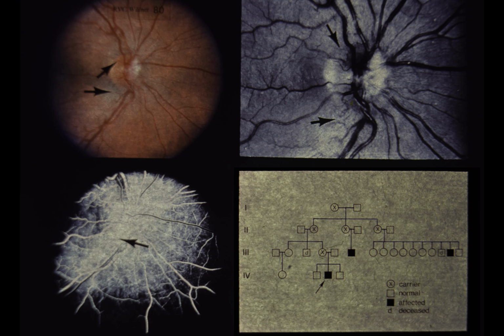Upper right. The telangiectatic vessels are even more apparent in this magnified red-free photograph. Lower left. The telangiectatic vessels fill with fluorescein, but do not leak. Lower right. A careful family history produced 2 male relatives with unexplained bilateral visual loss and optic atrophy. Complete workup in both patients revealed no evidence of an intracranial mass. A diagram of the pedigree indicates that this disease is transmitted as an X-linked recessive trait in this family.